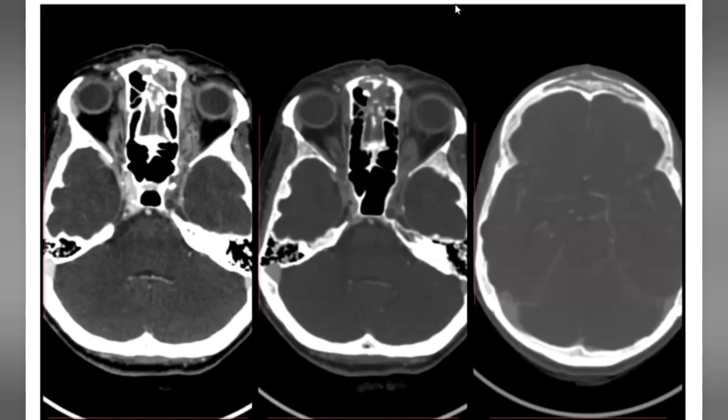Assalamualaikum. I'm provided with multiple axial CT scan images of this as well, with soft tissue and bone windows. There appears irregular enhancement of the medial aspect of bilateral orbit, extending towards the orbital apex into the bilateral cavernous sinuses, more so on the right. Anteriorly, this enhancement is extending towards the prefrontal soft tissues as well.